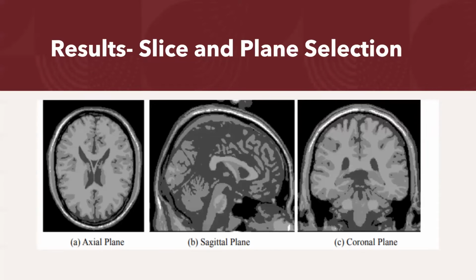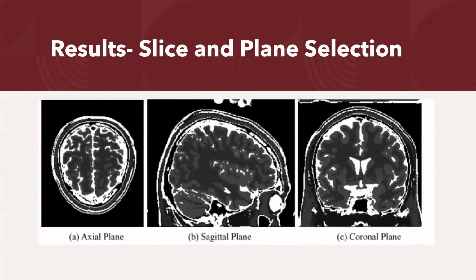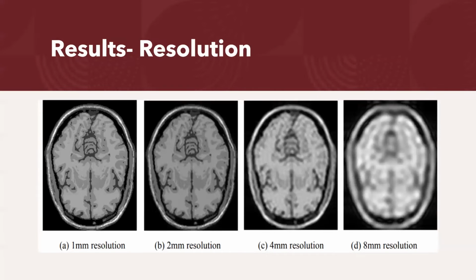So I would like to share our results with you. In the following images, you can see that we have reconstructed using T1 weighting with the gradient echo sequence for 3 different planes. For the next images, we have T2-weighted images for the spin echo sequence, also reconstructed in 3 different planes and with a different slice selection, as we can select our slices.